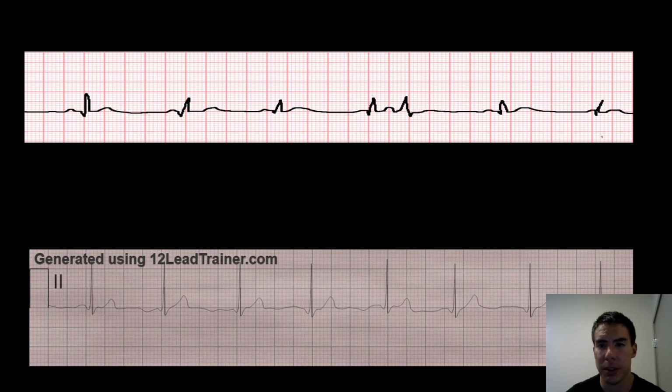So this top one right there, we have an ectopic beat, and I was trying to make it right partway in the T wave, but it ended up looking like a P wave that's in there, or a T wave by itself right there. But the next part over here is what's supposed to be the inverted P wave, but I'll just give that one to you since that's my poor drawing. This is a PJC, otherwise normal sinus.